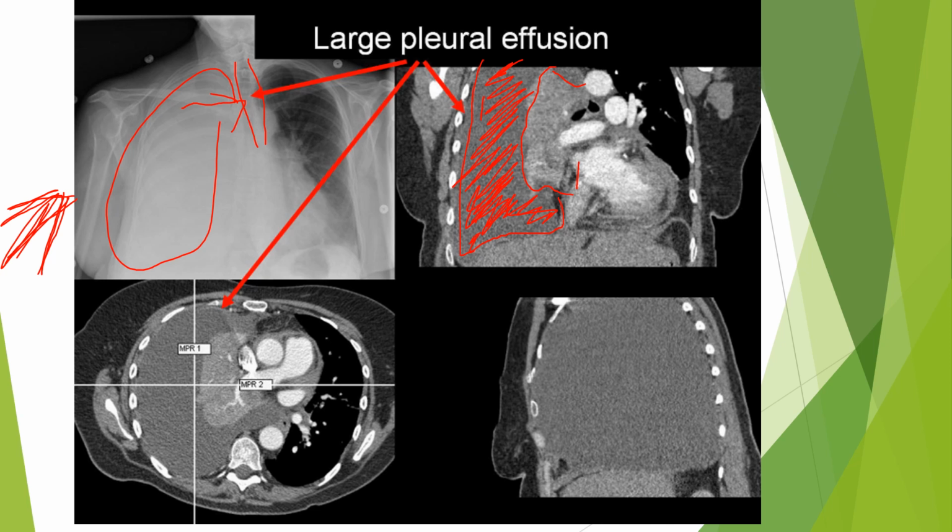And then this is just the anterior view on the CTs. Here you see the heart, right, and all that stuff. Here is the top view. Remember the sternum's up here. The spine is at your 6 o'clock position. And here, remember, which lung is this? Hopefully said this is the right lung. This is the left lung. So then you can see the outline of the heart here.